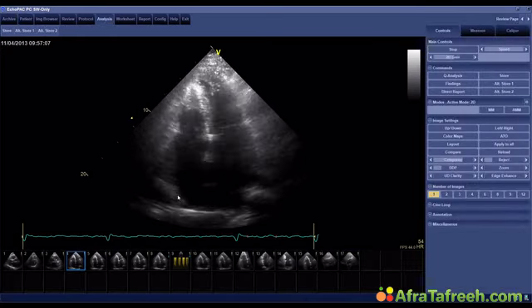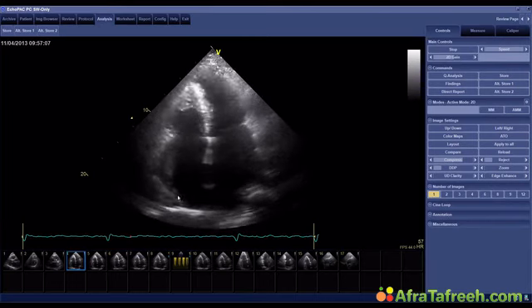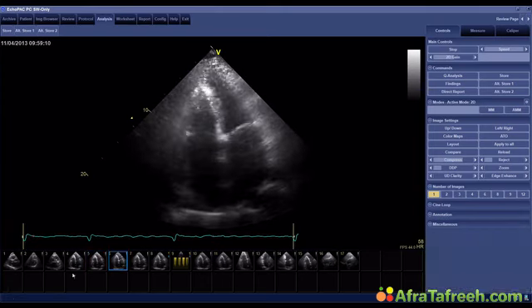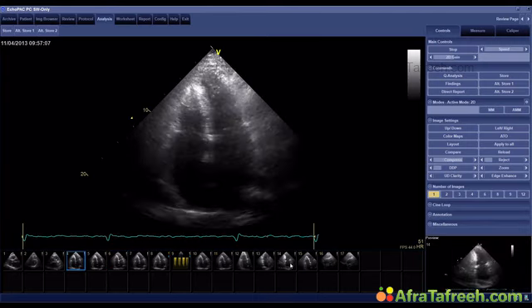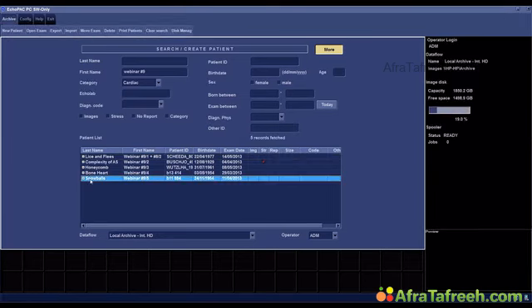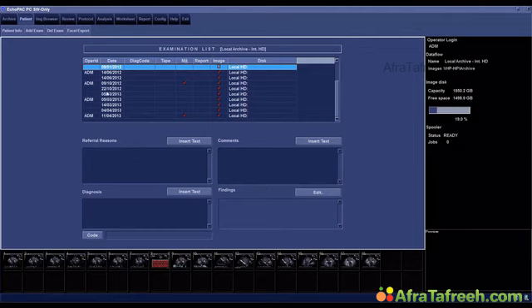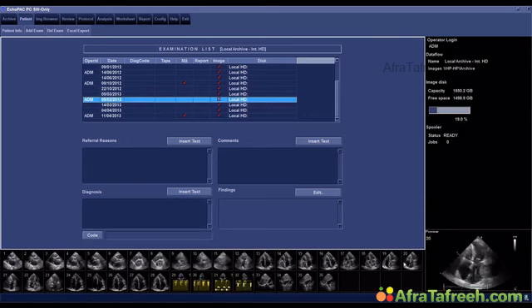Now, what you can see here is obviously that there is something in the right ventricle here, right atrium here, right here at the lateral region, right here, and there's also something right here in the right ventricle, right? And then if we twist and turn, let me just go back here one second. I think it's easier to see here, maybe. I just have to find the right image loop. Here we go. I think this is the best.